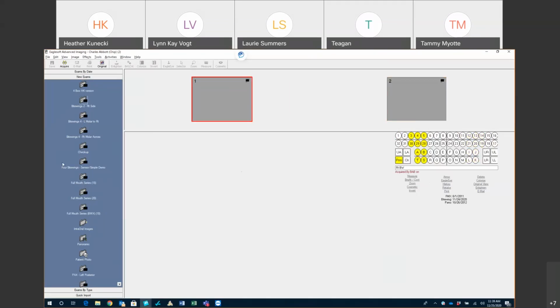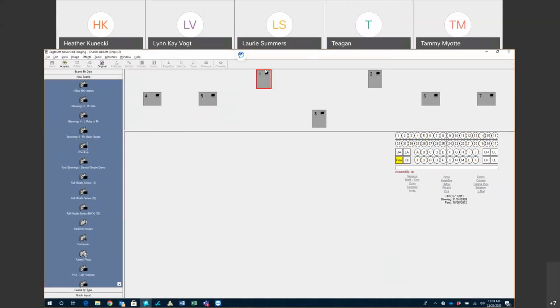If you ever see any images, like let's say this checkup right here, notice I don't have any teeth highlighted with this template. I can say which teeth I want to take pictures of. So probably not 5. And then you can do 8, 9, and 10. And once you highlight these, it stays like that forever. So it updates the whole template. So if you decide to create a new template and you're like, why isn't it updating my images over there on my tooth chart? It's probably because there's no teeth highlighted over here. So you just have to simply click over here and just see.